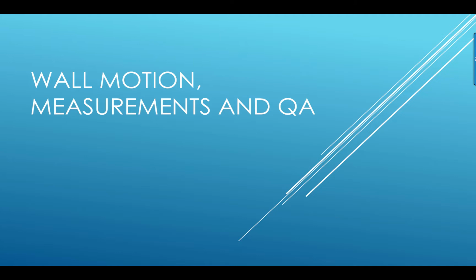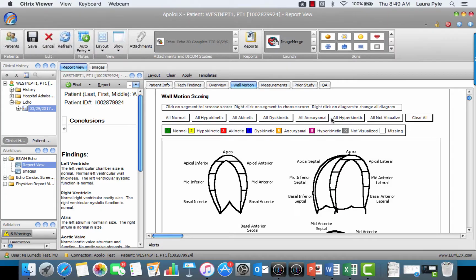Wall motion, measurements, and QA. Wall motion scoring diagrams are available in the Echo workflow. These allow you to enter wall motion data in a graphical representation of the heart. Scoring results are numbered and color-coded and can be adjusted quickly using the mouse.